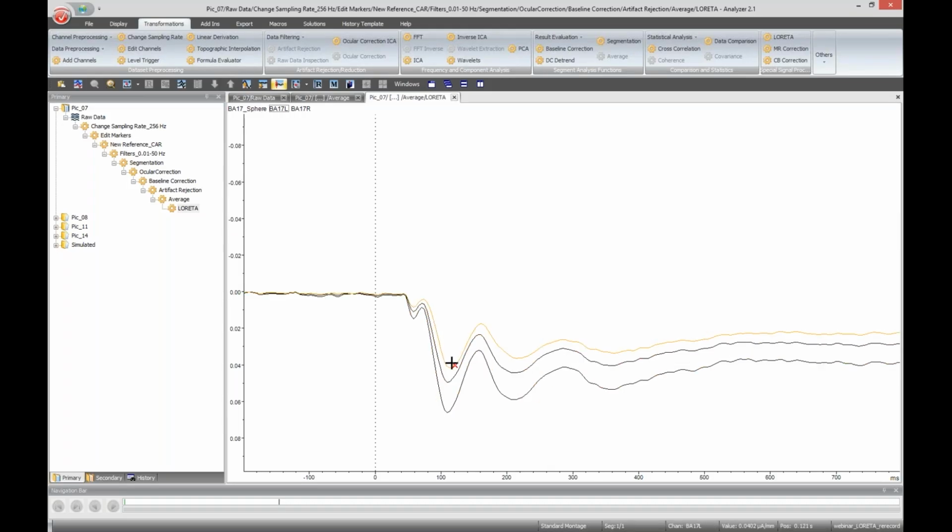The reason is that the activity is computed just for a single voxel inside a sphere, so you get a high source strength. Whereas for these 2 source time series, the source strength was created by averaging all the voxels confined in the left hemisphere, and for this one, all voxels confined in the right hemisphere were averaged.